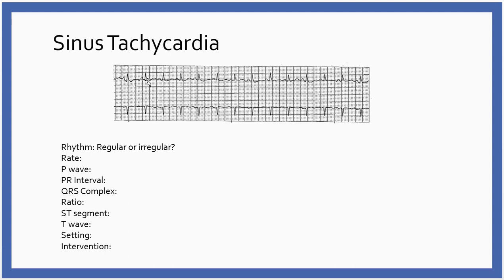Next thing I'm going to look at is the ST segment. Let's get over here where I don't have a bunch of artifact. Let me see. Okay, this is still a little bumpy, so if I kind of draw my ST segment, there are some spots. I see some wonkiness here, which I think is probably movement and not actually ST segment depression, because when I see something that's cleaner, yeah, I might have a little bit of ST segment depression here.